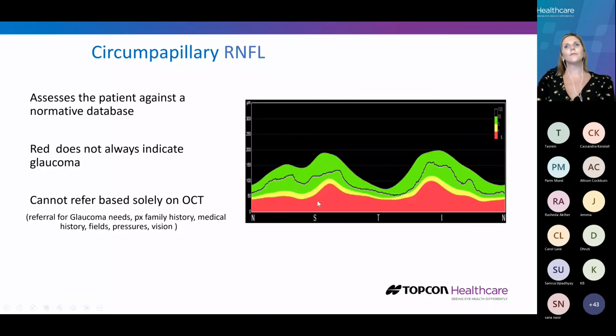Now, you'll probably see grids and graphs that help you to understand how thin or thick your patient is in comparison to a norm. This is a circumpapillary retinal nerve fibre layer graph, and we've got the temporal section in the centre. So we've had a circle sector, if you like, that's been captured around, split at the nasal point, and that's where we're looking at the analysis for this patient as a black line, being the patient. Now, we know we're going to have peaks.